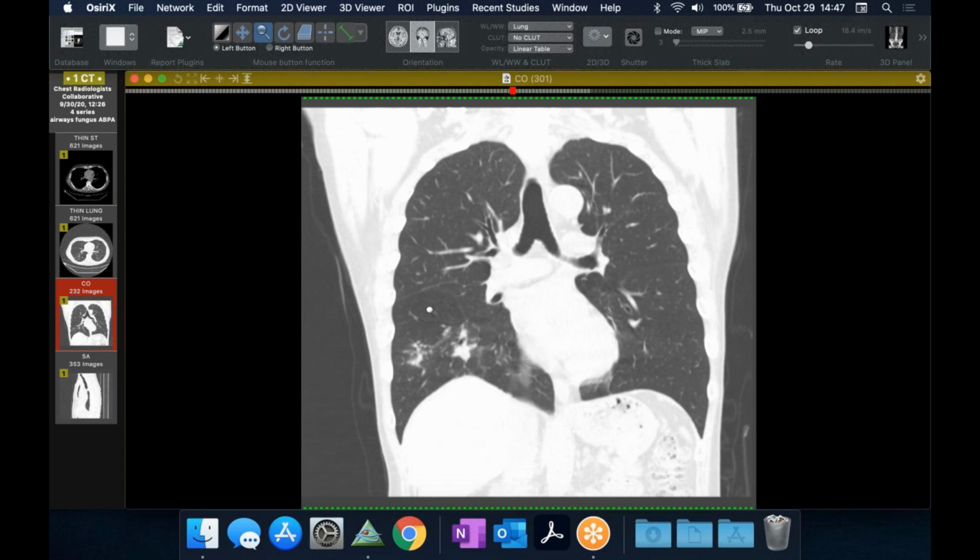I will show on his soft tissue windows, you'll notice there's some mucus plugs that are denser than blood pool. There's one there, and there's a couple other ones as well. Assume it doesn't jump around on me here. There you go. Just use the keyboard here. One out there, and if you look around, there are a couple of them that are a little bit dense.